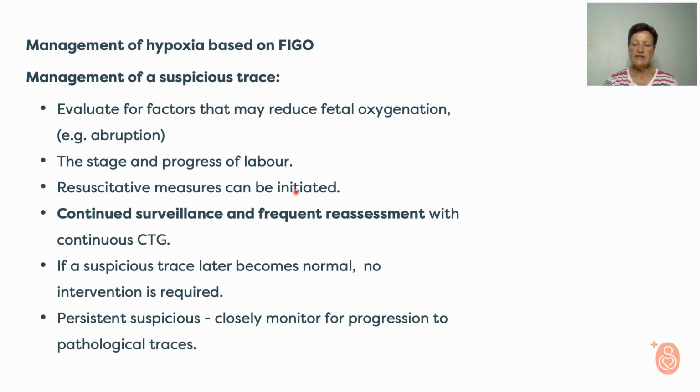Resuscitative measures can be initiated, which we will come to just now and see how we can resuscitate the fetus. It is unbelievably important to continue surveillance and frequent assessment with continuous CTG. One so often sees abnormal patterns of the CTG, and a decision has been taken that it's abnormal, but then the CTG monitoring is being stopped and there's no further CTG monitoring.